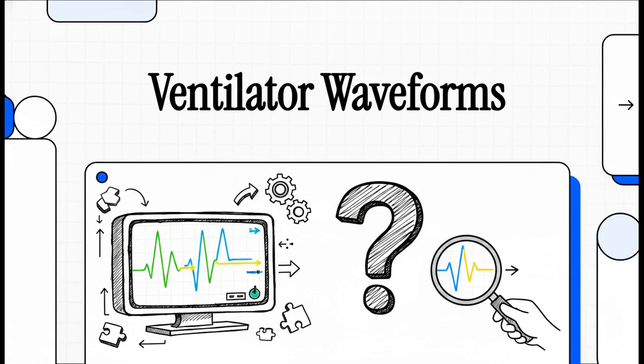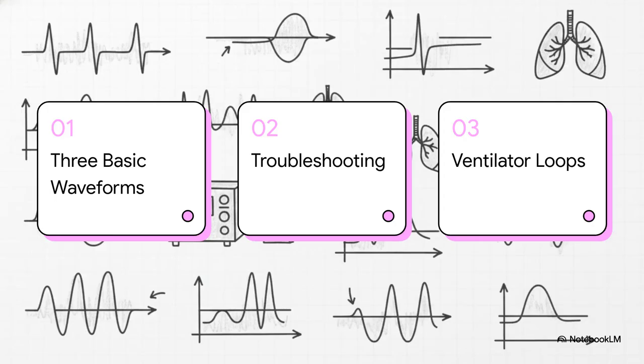Well, welcome to this explainer. Today, we're going to change all of that. Consider this your personal medical detective's guide to translating that language. We are going to decode exactly what those waveforms are trying to tell you so you can step up and intervene quickly and confidently. Okay, let's dive right into this.